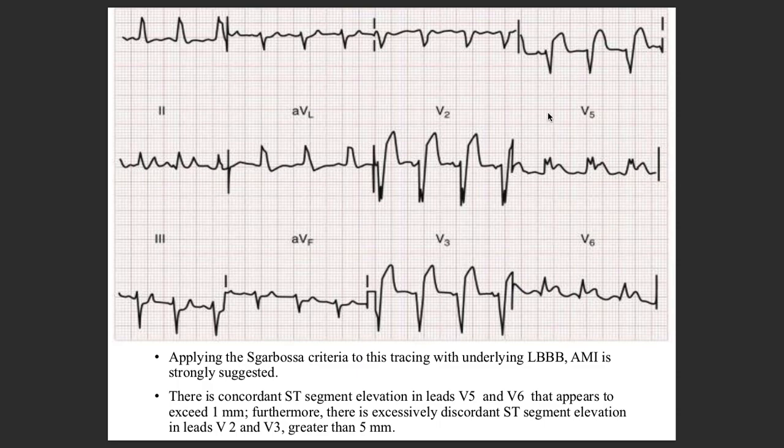So what is happening in this ECG now? For example, the second ECG. As we can see again, sinus rhythm, sinus tachycardia is going on. Wide QRS, there's left bundle branch block, right? So the answer is already given over there. So go for the answers, I would say.